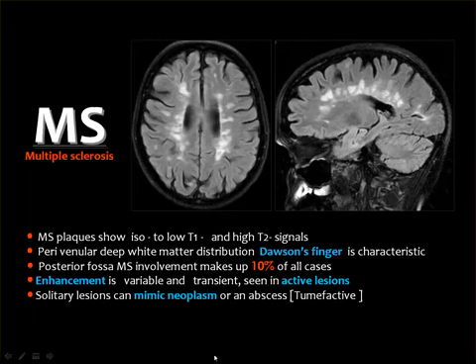The appearance of the lesions is also very familiar to all of you. The lesions will be hardly seen on the T1 weighted image, but easily appreciated on the T2, especially in the FLAIR sequence. The lesions are horizontally oriented, perpendicular to the wall of the ventricle, described in the literature as Dawson fingers.